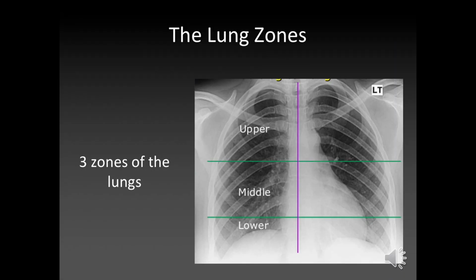So now going on to the lungs. The lung is split into zones, which are different to the lung lobes. Obviously lungs have 3 lobes on the right, 2 lobes on the left. You kind of forget about that with chest x-rays, and you talk more about upper zone, middle zone, and lower zone. The reason you do that is because it's all dependent on the pressure, and different pathogens, different conditions go up and down in different areas. So for example, some conditions just affect the upper zone.